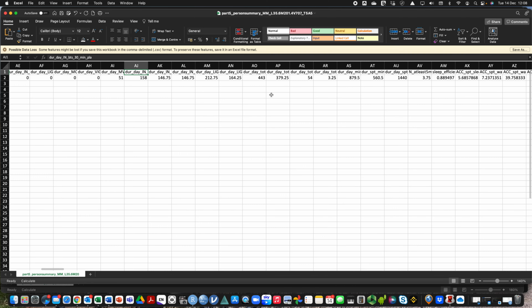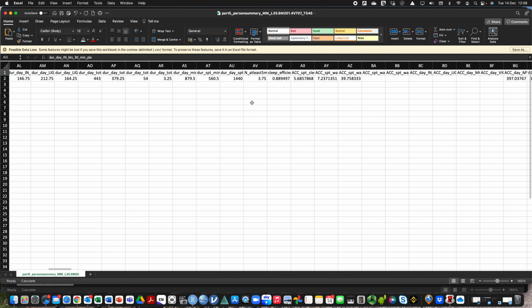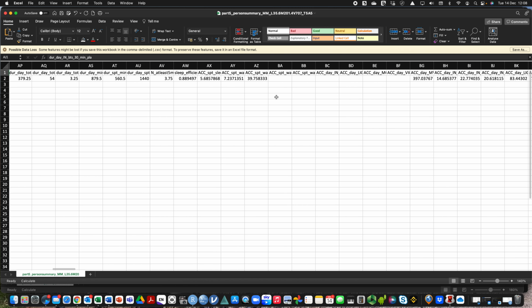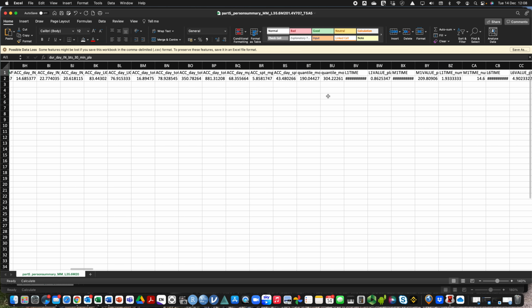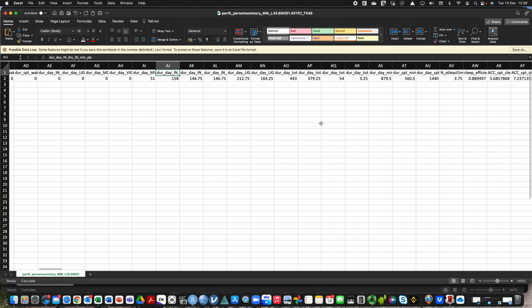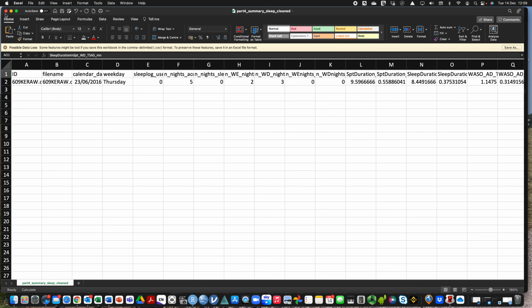Again, the order isn't always necessarily that logical, and as I said earlier in the earlier video, we've got fewer metrics or variables in this part 5 output than, for example, part 2, which is just physical activity, and similarly for part 4, which is just sleep. So this is, if you like, the summary of both activity and sleep. But if you want some specific variables which are not here, you're going to have to look at part 2 or part 4 or both together and then merge them together. And again, very comprehensive data sheet in terms of what is being spilled out here.